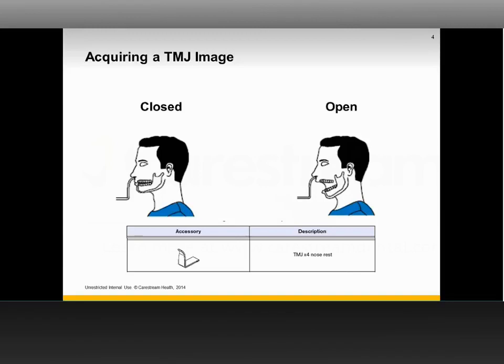So you capture all the anatomical details on the closed view and do a fast scan with less radiation, and you get enough to understand the position of the condyle in relation to the articular eminence. That is a huge advantage. To reiterate, you get the detail in the first scan with the closed view, and if you do need the open view, you can do it in low dose. You can still visualize the articular eminence very well.